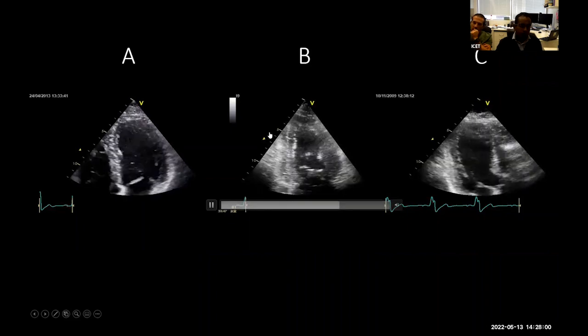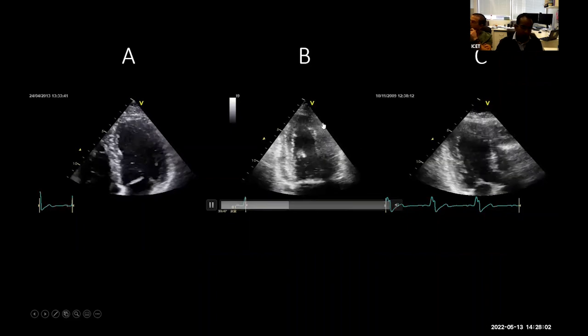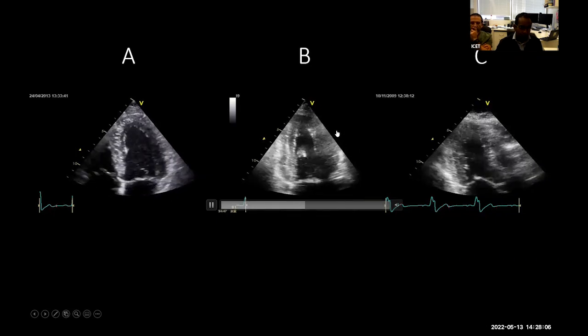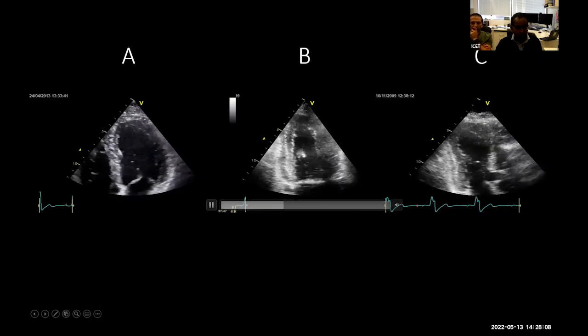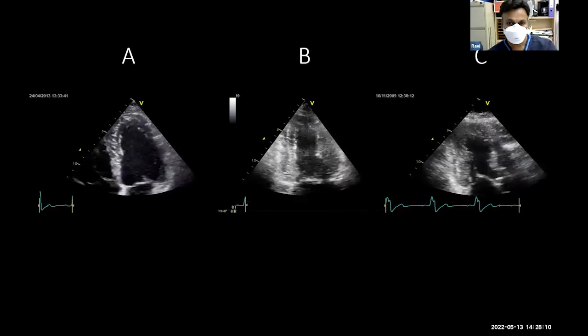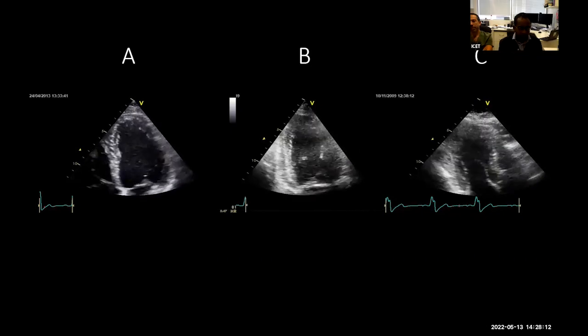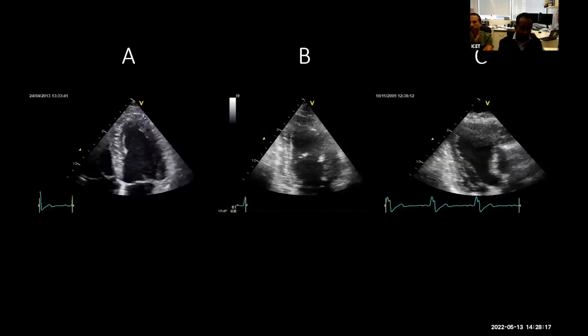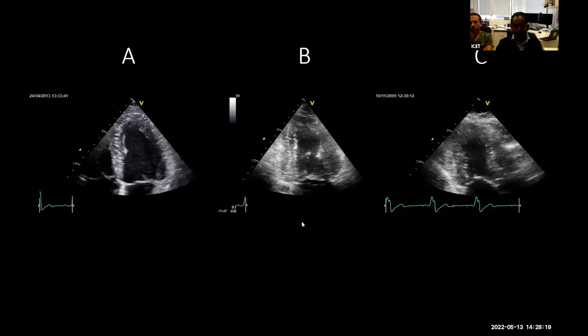But yes, you can still use it for strain. What you can do is exclude that segment where you don't really have good enhancement. You can get probably 4 or 5 other segments of regional tracking, and then exclude the one where it's not really tracking at all.